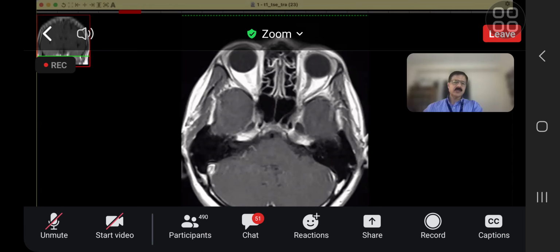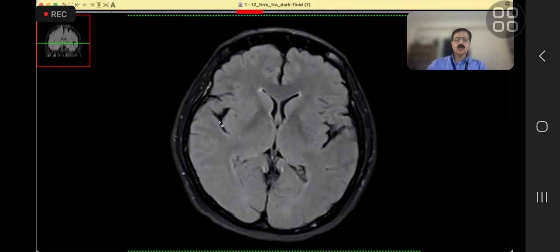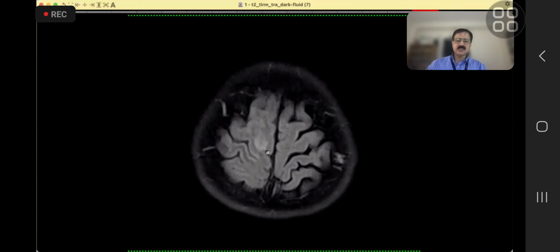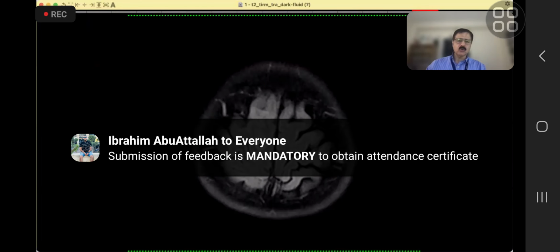Now, our case on Osiris was very well picked up, where I showed an initial FLAIR. This is the FLAIR, and the key thing was to keep continuing till the top. Here one can see that the gyrus is high intensity. Of course, on diffusion it was slightly high, but it was not low on ADC, so it was a T2 shine through.